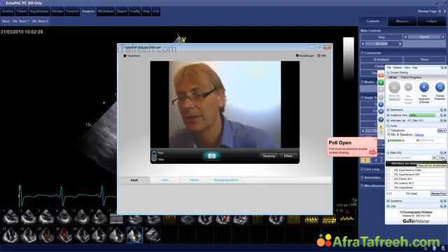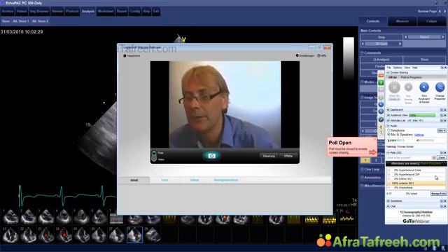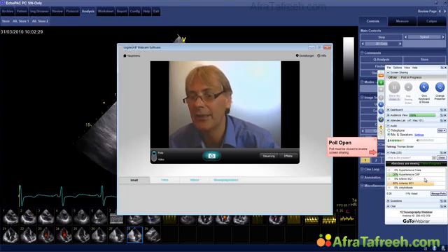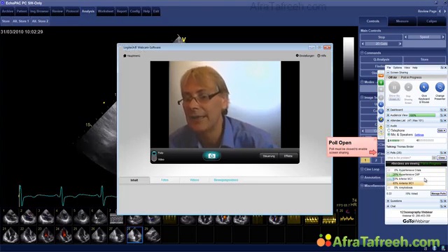Does he have hypertrophic cardiomyopathy? That would be the second possibility. Do you see an inferior myocardial infarction, or you see an anterior myocardial infarction, or an amyloidosis? Okay, only 5 have voted yet, 9, 11, 18%. Okay, so you're coming along here quite nicely.